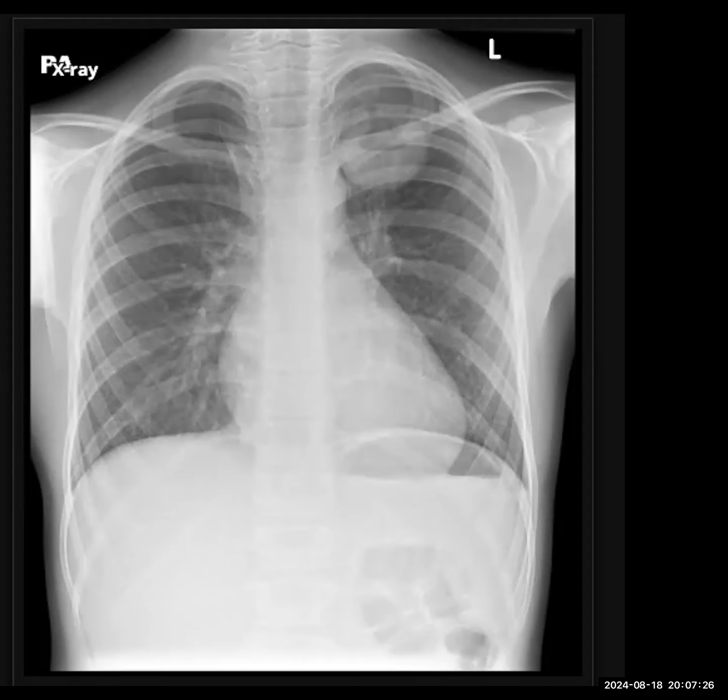In an adult patient with this presentation, this could either be infective or this could be something more sinister. I would convey these findings to the referring clinician, and see if there are any previous radiographs available for comparison, to see if this lesion was present before and if there are any signs of progression or if it is a stable appearing lesion. I would also want to know the clinical history of the patient. If there are raised inflammatory markers, this could be an infective focus. If it's an elderly patient, this is concerning, and I would want to go ahead with a CT of the thorax for further evaluation. Thank you.